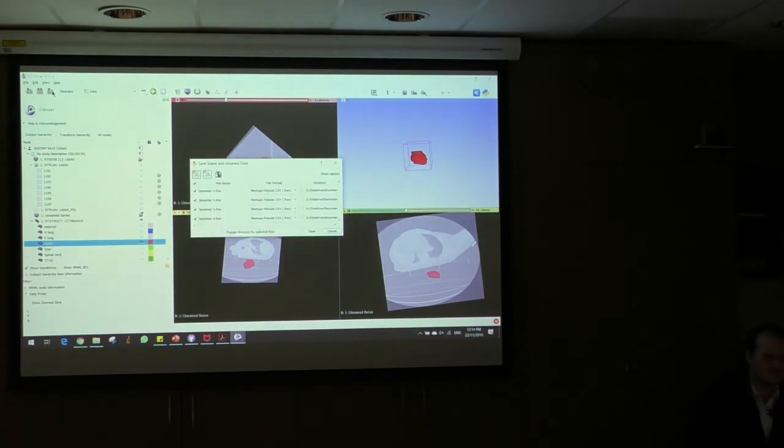But you have a save function here, and through this drop-down menu, you can locate the model of what it is called, and from here, you can select, all right, I want to save that, for instance, as an STL file, which is common 3D printing language, and that will generate the 3D model that you're after. And then from there, you can go into opening that model up in any AutoCAD software, and it'll create that mesh volume, which is what you're after. Specifically in my project, that's exactly what I was after.